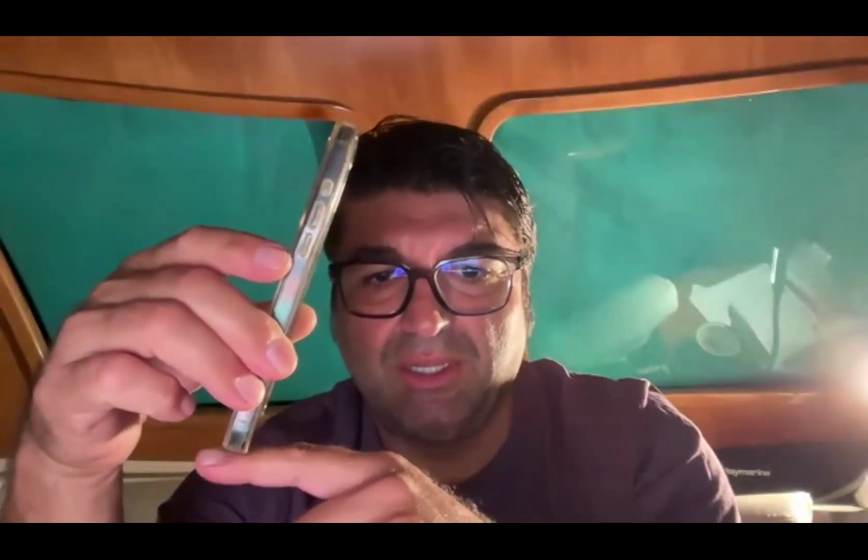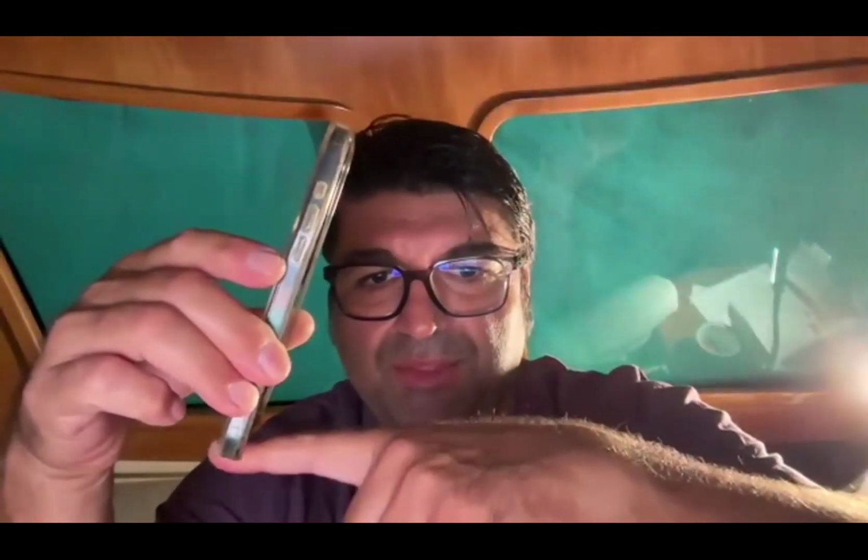In the frontal view, like this, you see the height of the central. If there is an angulation, the height is from here to here, but what you see here is an angulated view, so it's not going to be the same value as this one.